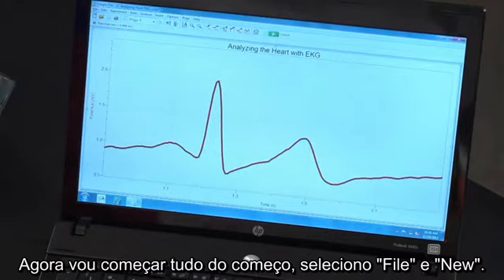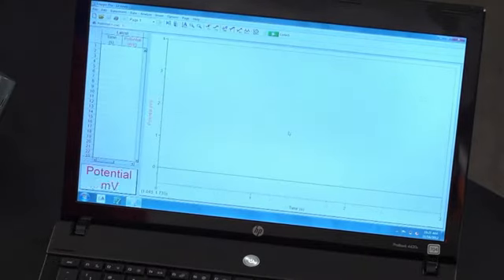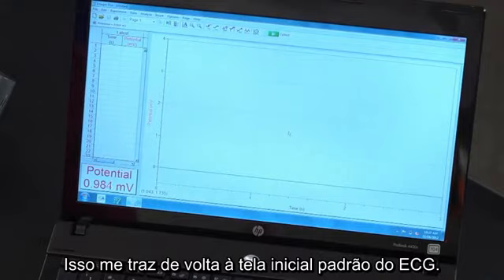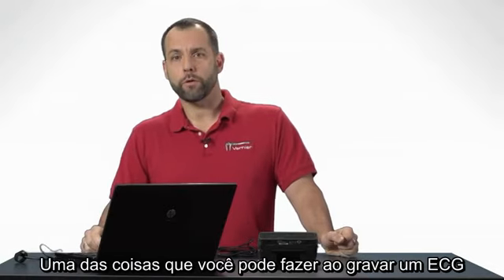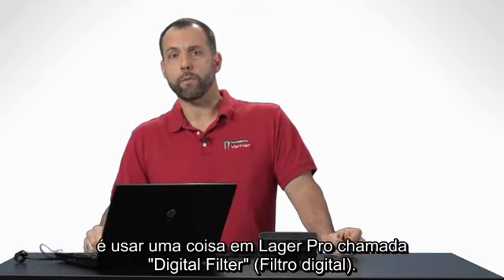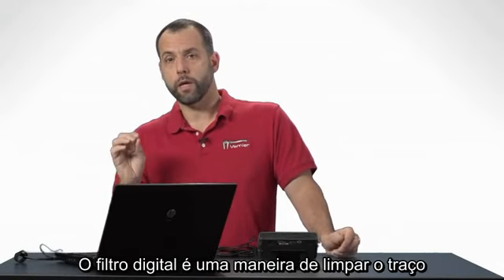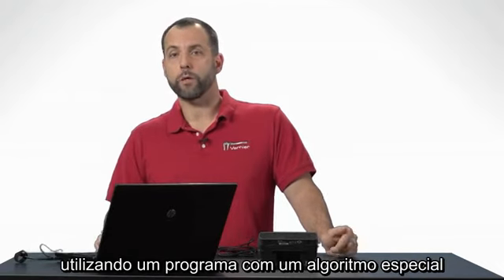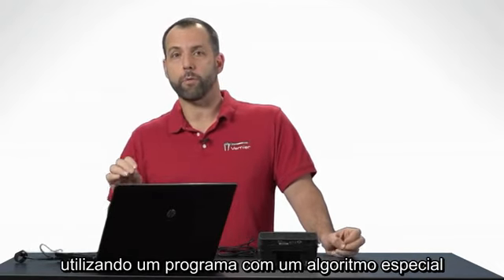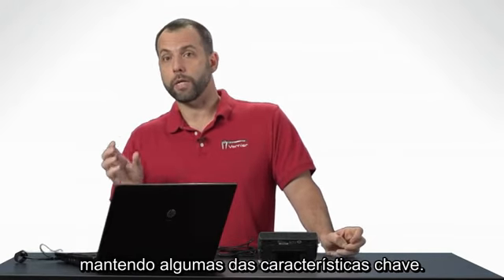What I'm going to do is just start completely over. So I'm going to say File, New, and this will take me back to the default EKG screen. Now, one of the things that you can do if you're recording an EKG is you can use something now in Logger Pro called a digital filter. What a digital filter is, it's a way to clean up a trace, but by using software. So we use a special algorithm in the software to make that EKG trace look clean and actually to keep some of the key characteristics.